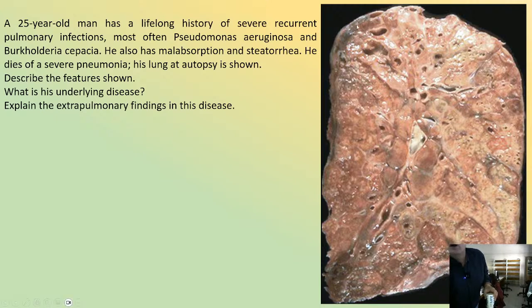So, why is this abnormal? This is a bronchus, like the other one we saw. Why is this abnormal? You'll take into account that we are at the lung's periphery, all right? So, why is this bronchus that you identify in this part of the tumor abnormal? I can see its lumen very nicely.